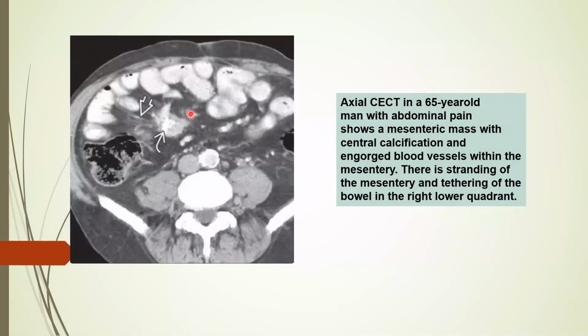This is another case, a large hyper-enhancing mesenteric mass with central calcification and engorgement of the mesenteric vessels and tethering of the mesentery.